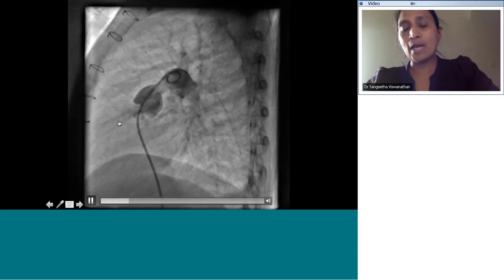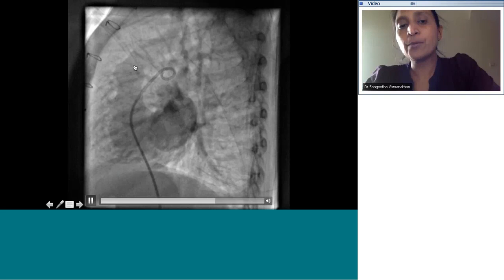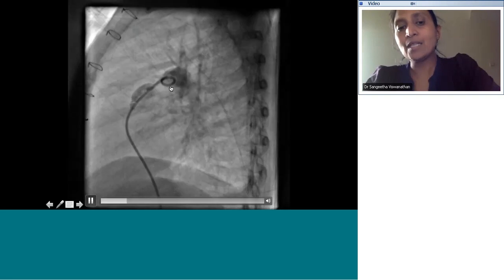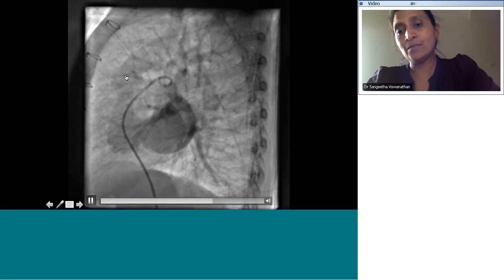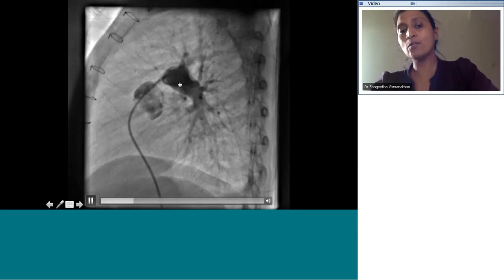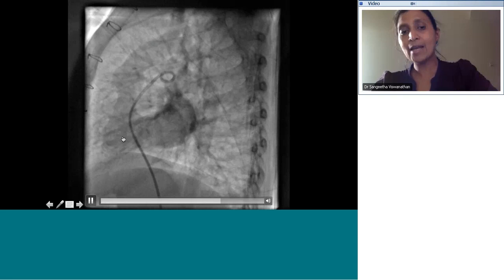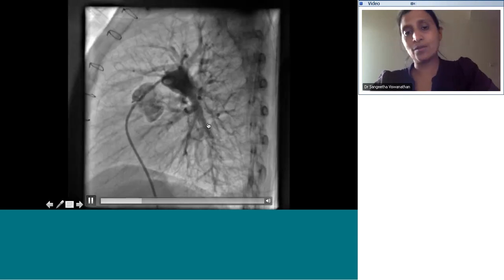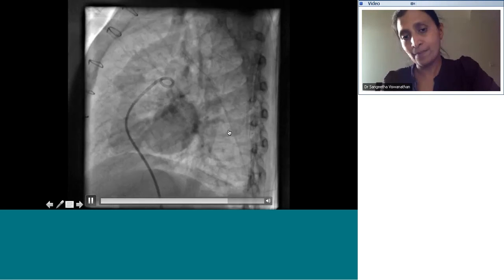What else does this angiogram beautifully show? The relationship between the great arteries. The pulmonary artery is posterior and the aorta is anterior, and it arises from the trabeculated RV. If you see the levo phase of this PA injection, pulmonary veins, LA opening into the RV and RV opening into the aorta. So a very nice demonstration of CTGA anatomy.